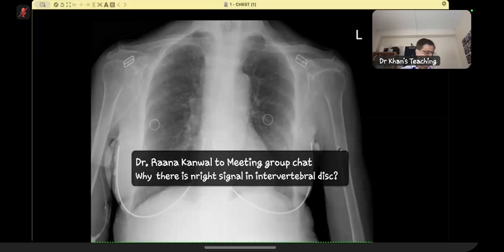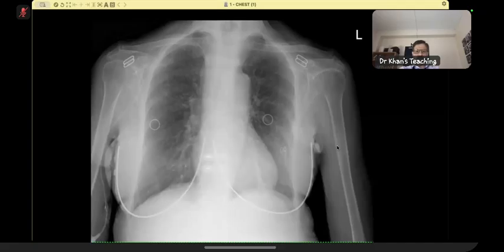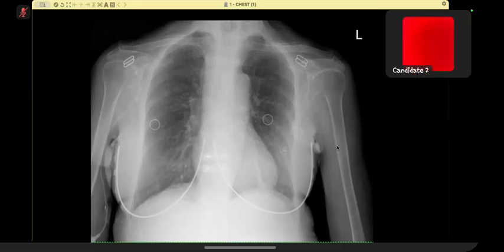This is an 85-year-old. The patient has loss of weight, also has dysphagia, and they did a chest X-ray. Over to you. Okay, so this is a chest radiograph, frontal projection, of a patient who presented with dysphagia and weight loss.